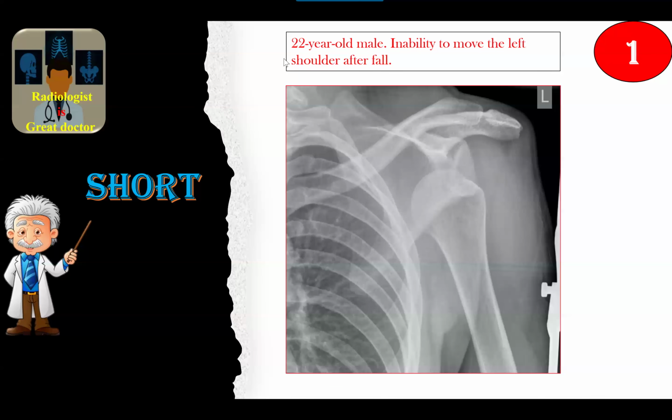This is the way to study radiographs for short reporting. Starting with my friend Dr. Umair. You will start with me in short reporting. Just describe it as a short case. What to do? Okay, sir. X-ray shoulder, frontal projection, left shoulder, in which I can appreciate that there is anteroinferior dislocation of the left humeral head, and no other bony injury can be appreciated.